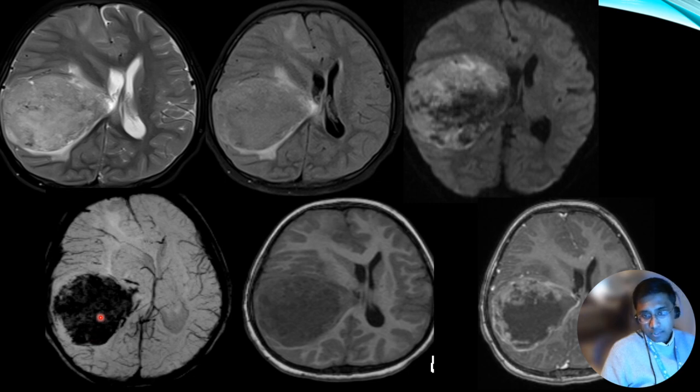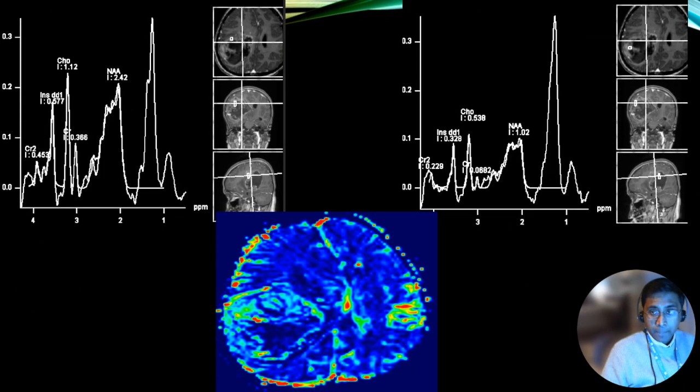It's difficult to tell with just the SWI images, and you can see that the mass is showing thick ring-like post-contrast enhancement with a large central necrotic area within. Even the margins of the mass tend to be enhancing. So it is something very similar to what we saw before, like the supratentorial embryonal tumor. And when you see the MR spectroscopy, we can see that there is a large lipid lactate peak and some degree of elevation of choline and some drop in NAA.